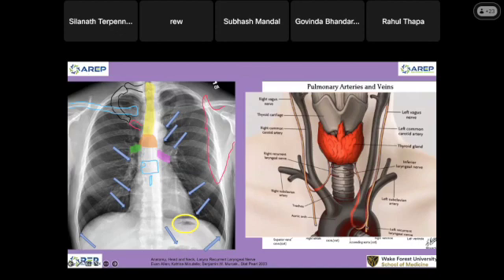So this is why my postgraduate practitioner has to scan the patient all the way down to the AP window to rule out possible mass in the mediastinum. Okay, look at my choice.